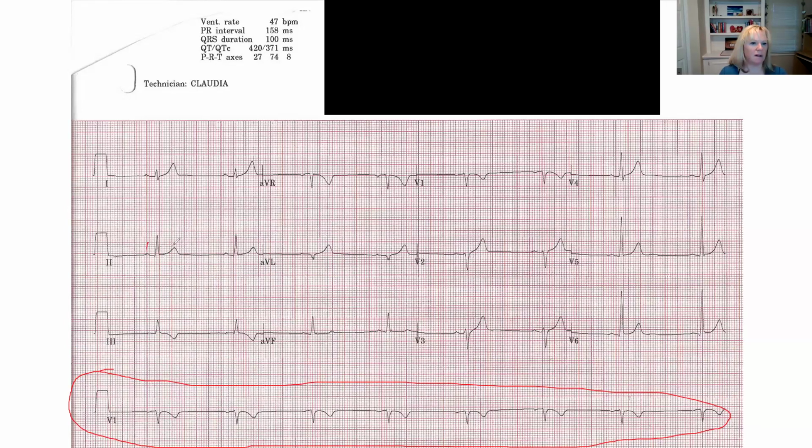I would go here and look at these P waves and I'd be like, yep, confirming I do have P waves. I have a regular R to R. Yes, this is sinus, but I've got a rate of 47. So this would be, yes, Chelsea, a sinus Brady. Good job. And also the QRS is a little bit wide, right?